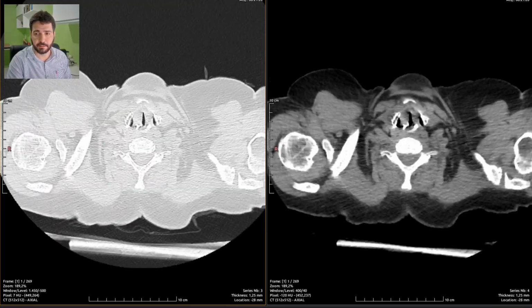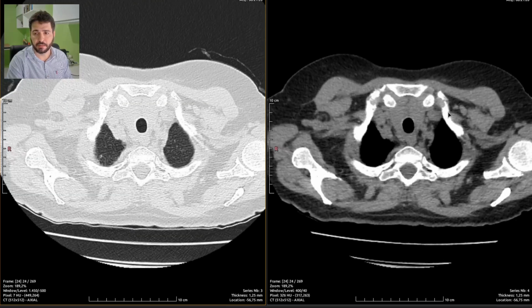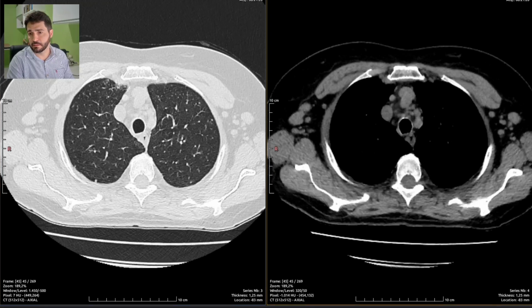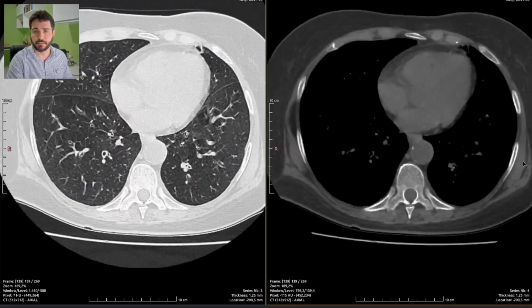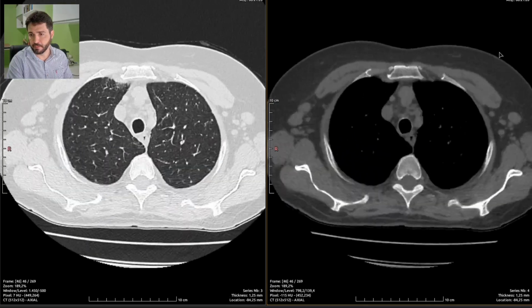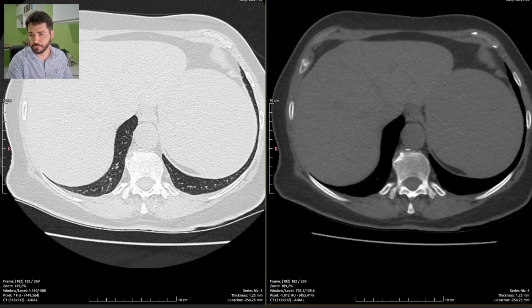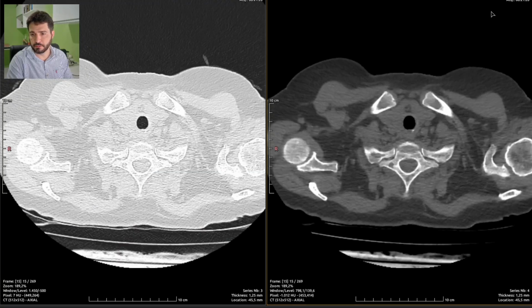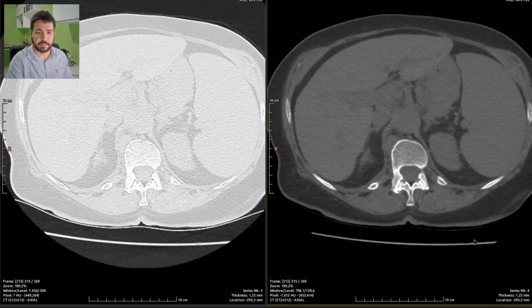This is a very peculiar case. The thyroid is also normal. Did you guys hear that? Yeah, my voice is acting up. And the spine shows a lot of degenerative disease signs. So let's report it.